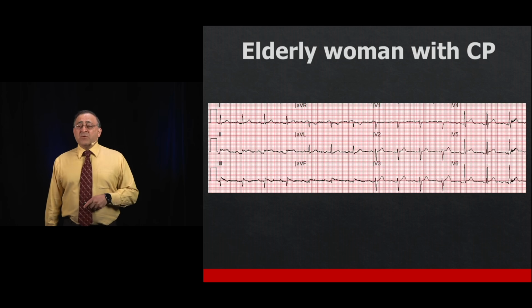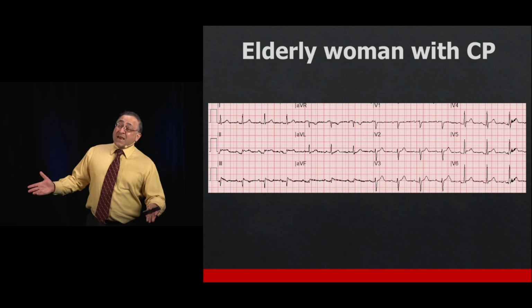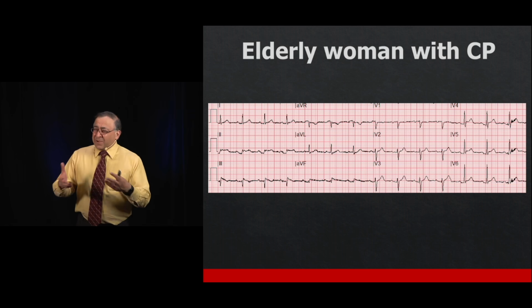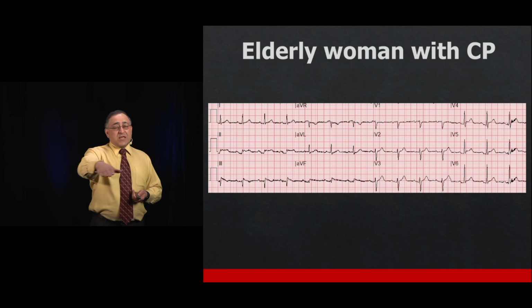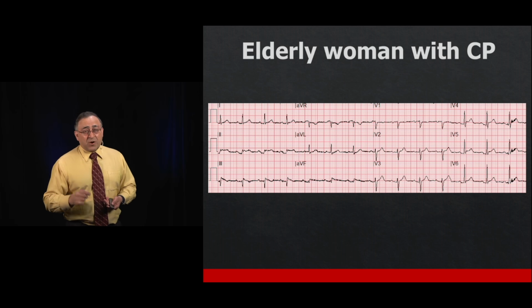Here's an elderly woman who comes in with chest pain. Realistically, elderly woman, do we even need to ask what's the diagnosis here? It's got to be a STEMI, right? Elderly women, pericarditis, I think it would be enormously rare. But anyway, this is the pre-hospital EKG. The pre-hospital providers actually diagnosed this patient with pericarditis.